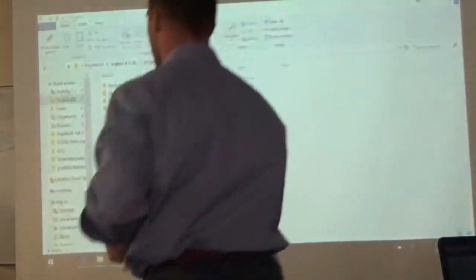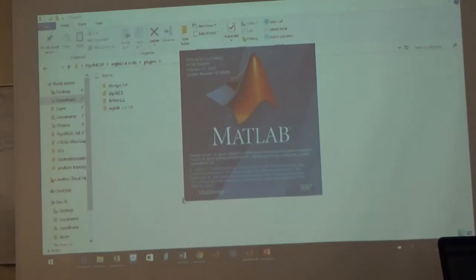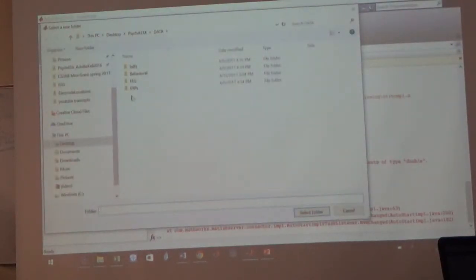Okay, guys, here's what we'll do now. We're going to just pick up where we left off. So you're going to do the events list option. You're going to create events list. Hopefully everybody has that up. We'll see how I catch up here in a second. Set the path to where we were.